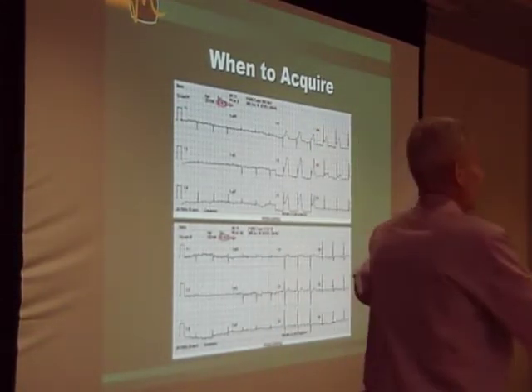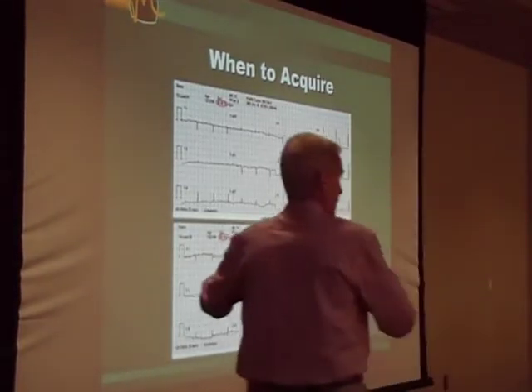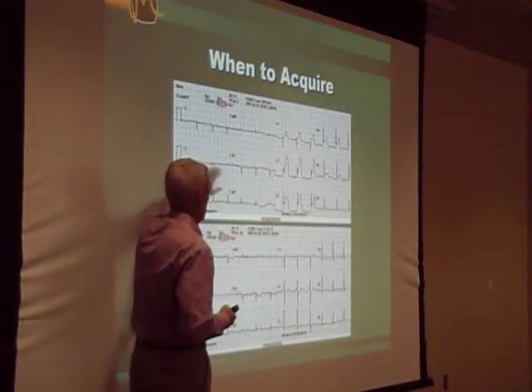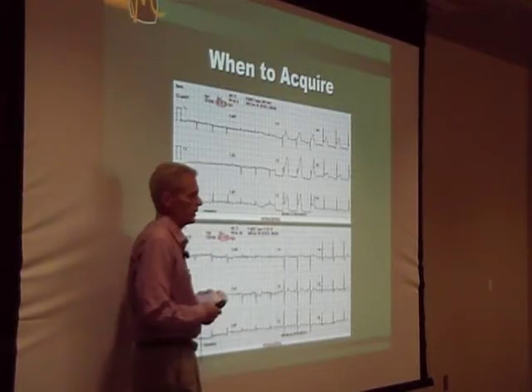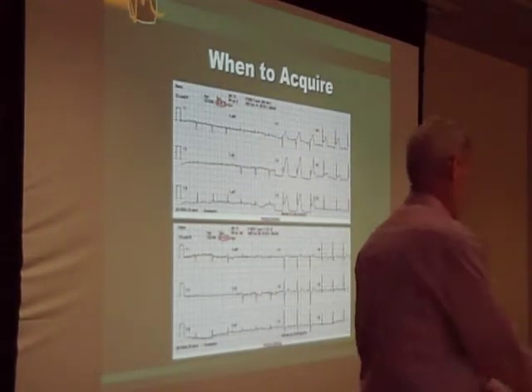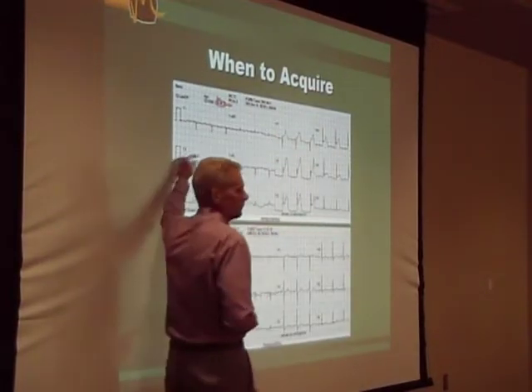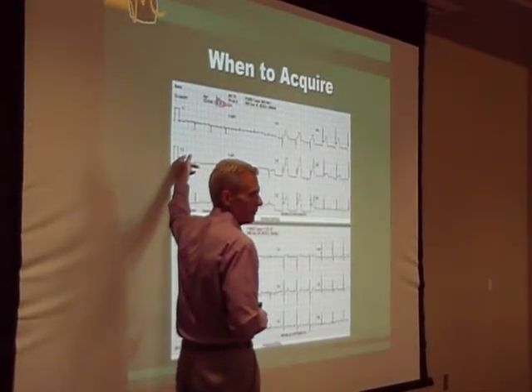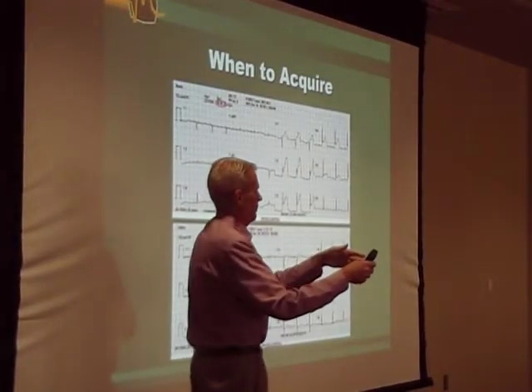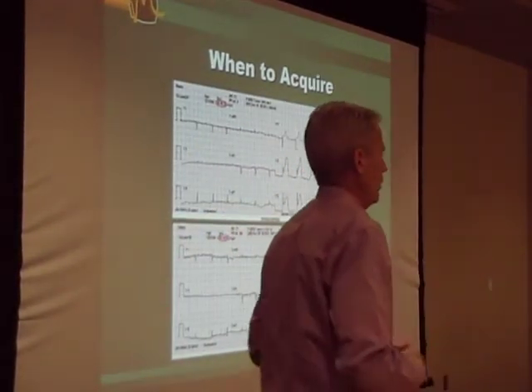You build a story over time with your patient. What's vitally important for my EMS people here, let's say you get there and I acquire this, it lasts for a few minutes, the next 20 to 25 minutes, I'm looking at this. You get the patient to the hospital, doctor comes walking in, well, that's a normal EKG. And then you show them the very first tracing, now their suspicion is much higher. You gotta share the transition of the story over time. It's part of the patient's not only history, but also where their treatment needs to go.